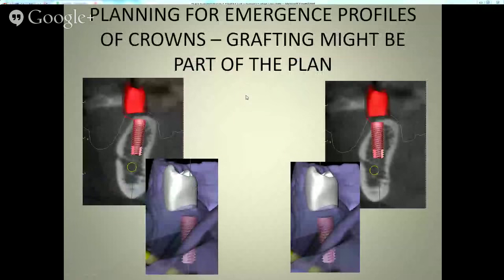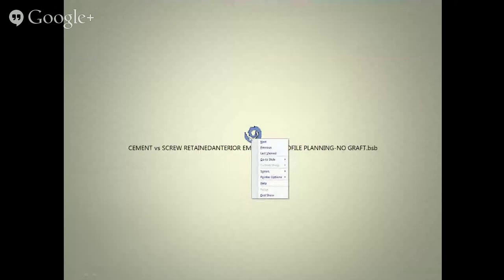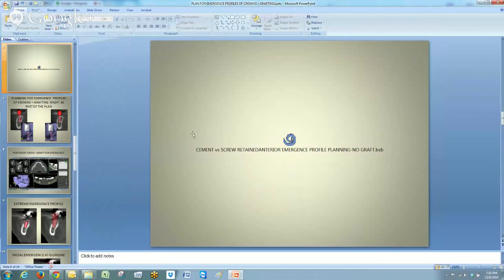So I have a case here that I'm going to open up and show. Let's see, I think I will. Okay. Let's do it this way.